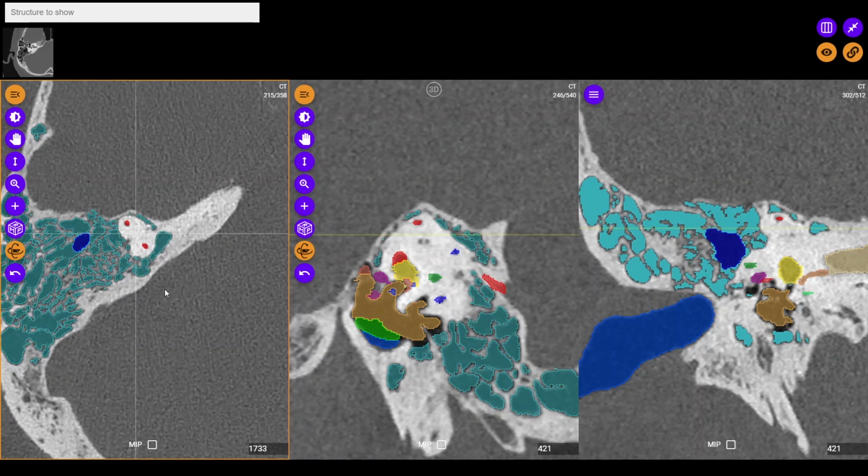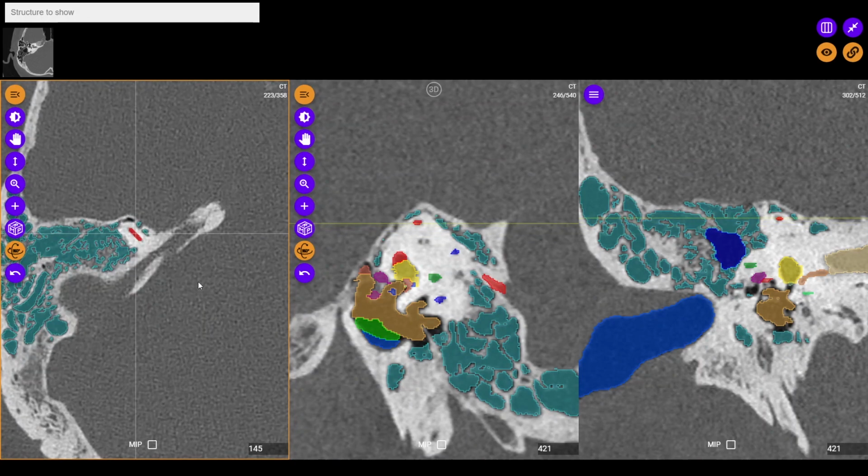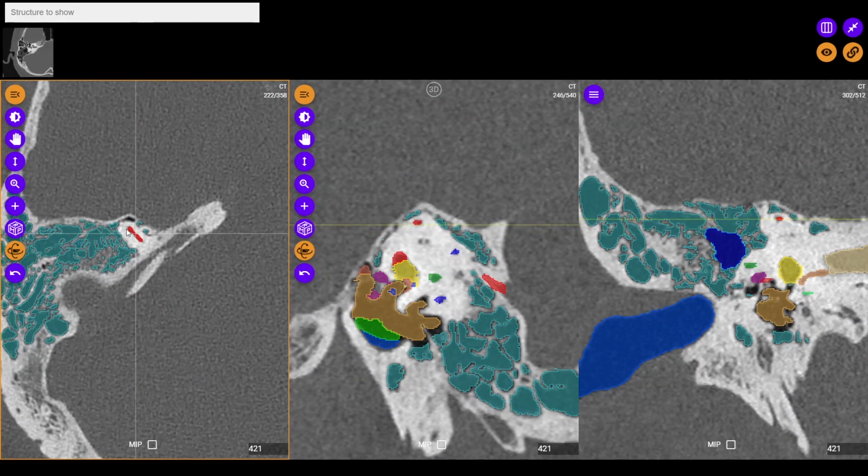You can also do this three-dimensional MPR or rotation of your axis on the annotated anatomy modules. So you can have an anatomy module, and let's say you wanted to make an orientation that's parallel to the plane of the superior semicircular canal, which you commonly get with these temporal bone CTs. Right now, obviously, in our temporal bone CT anatomy module, there's just one thin section. You can do MPRs on it, but using the typical MPR just goes to the three orthogonal, typical axial, sagittal, coronal orientations. Now, you wanted to make your own oblique coronal or oblique sagittal through the superior semicircular canal.